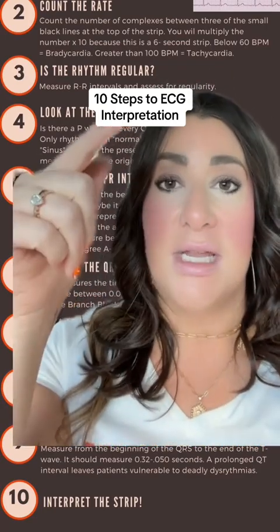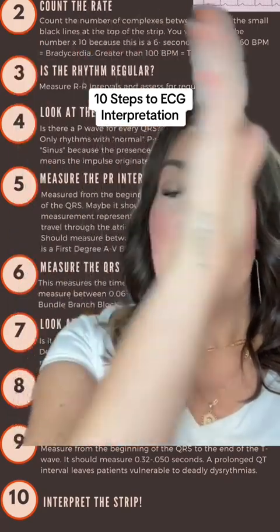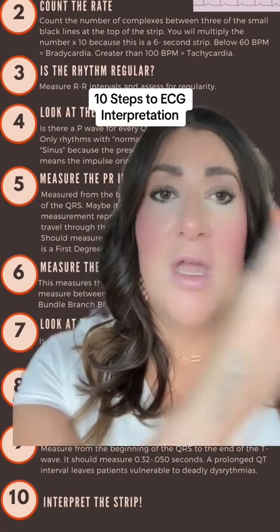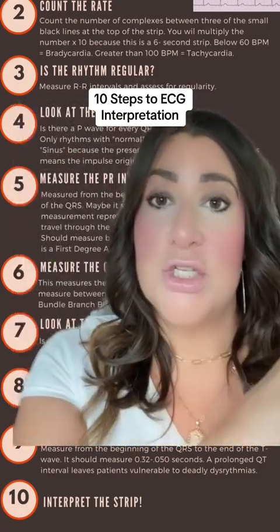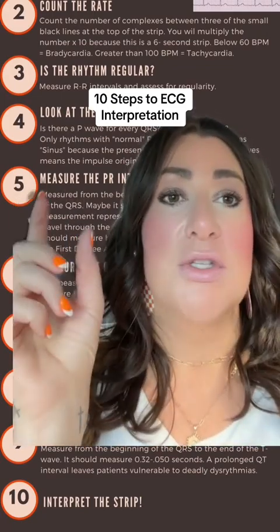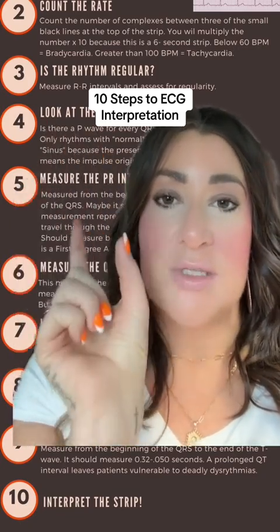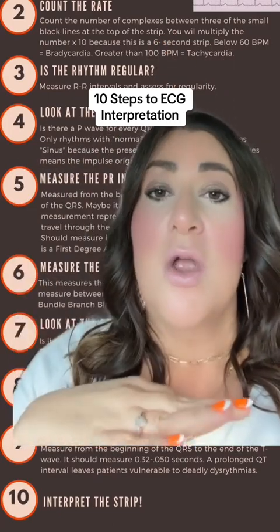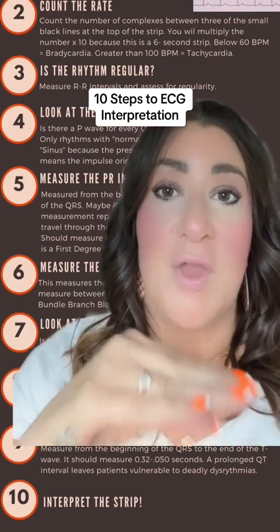So breaking it down again, first you need to know your measurements. 3 little markings on your strip represents a 6-second strip. To count the rate, you count your R's within that 6-second strip and multiply it times 10. That's going to give you your rate. You also need to know that a small little box represents 0.04 and a bigger box within the strip represents 0.20 seconds. These are all measurements of time.